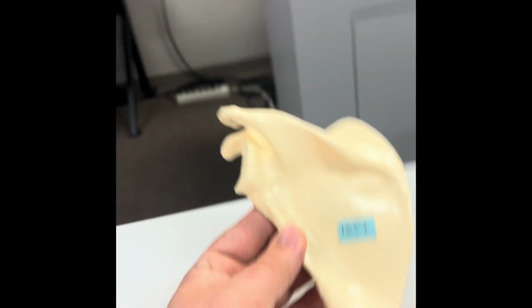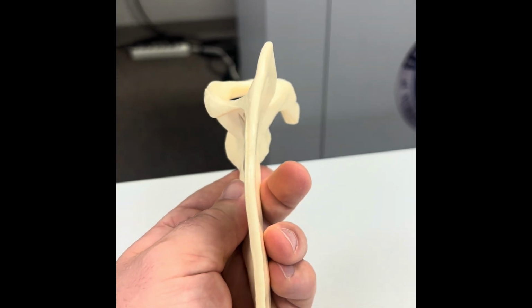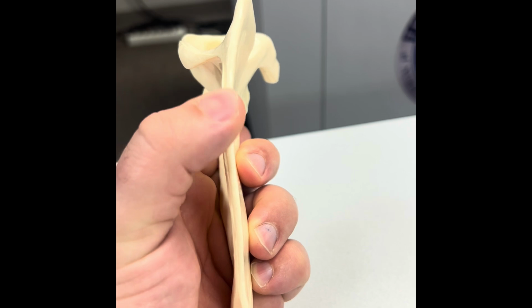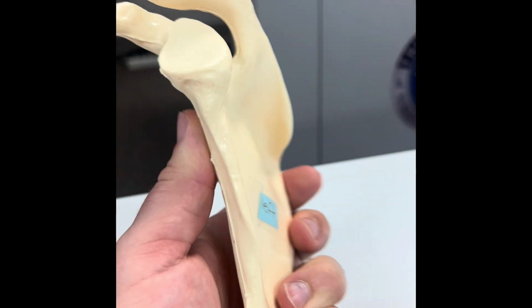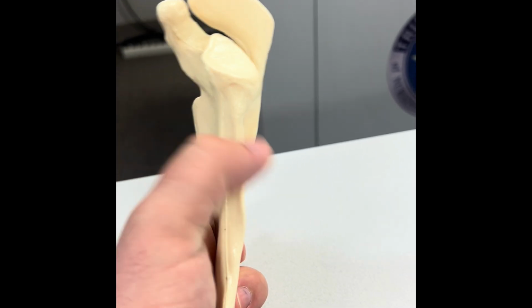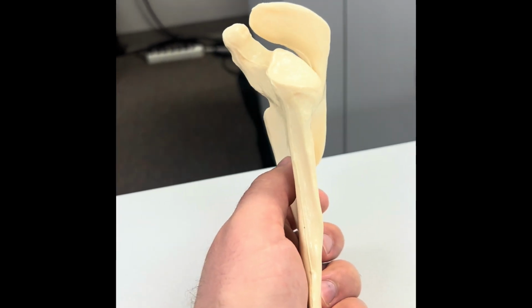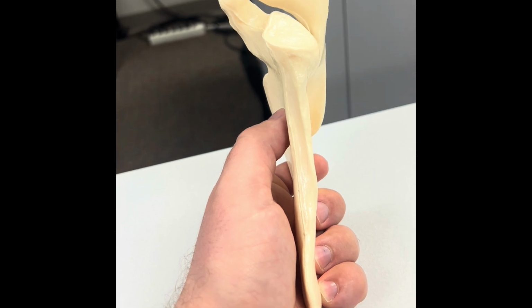So looking at an individual scapula, here is the left one. Here we can see the medial border or vertebral border, and it's much thinner. It just has a single little margin. If we flip it around at the lateral part, we can see it's got these almost two cortical margins. It's much thicker. So this is how we can easily identify the lateral versus the medial.